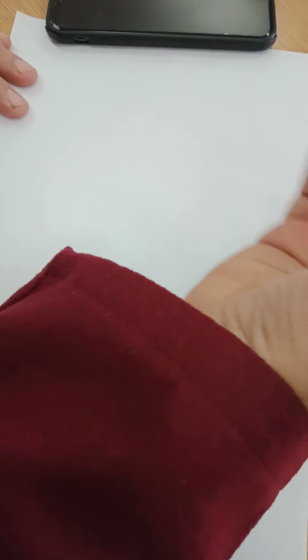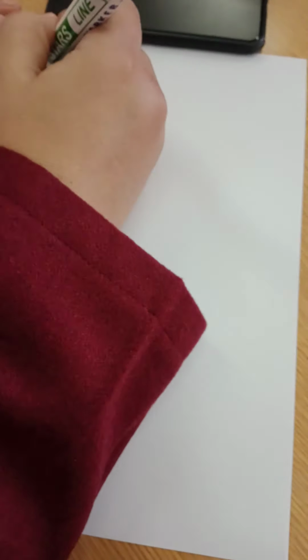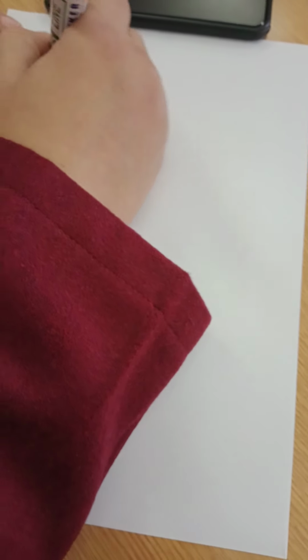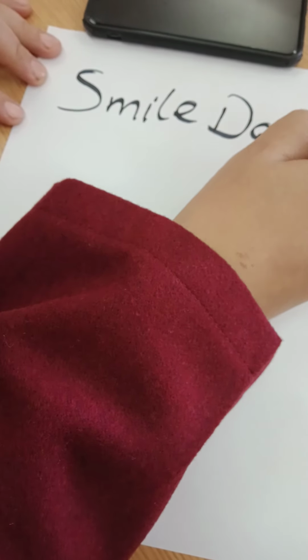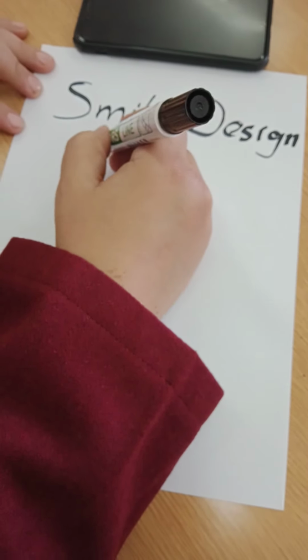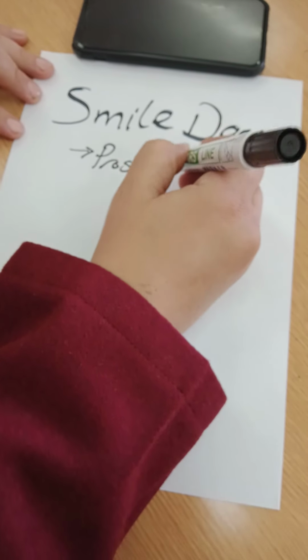What I'm looking for, actually, I'm not aware of the dental systems that are available, because I've seen some on YouTube and I'll show you some that I've received as images. But the idea is, I want maybe the help of people on the net to give me some system where they can merge smile design. And why do I need this smile design? Because I want to make my restoration called prosthetically driven. What is prosthetically driven?